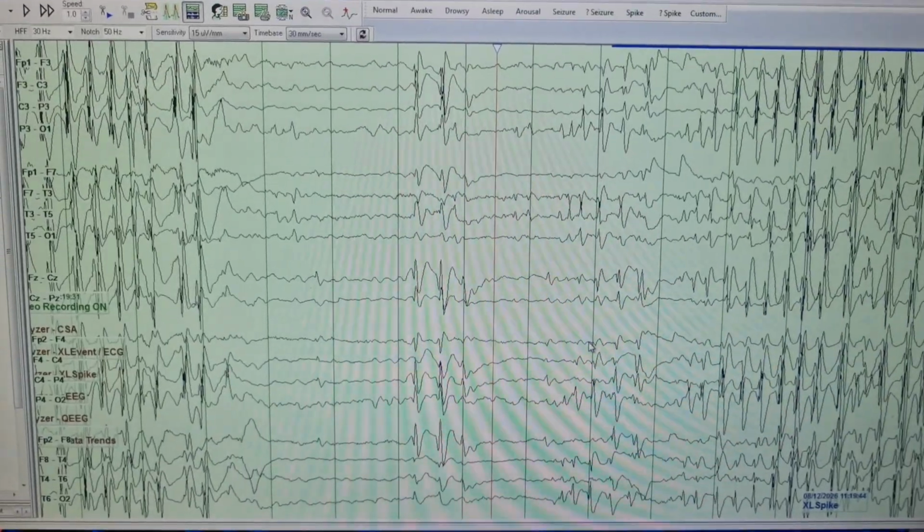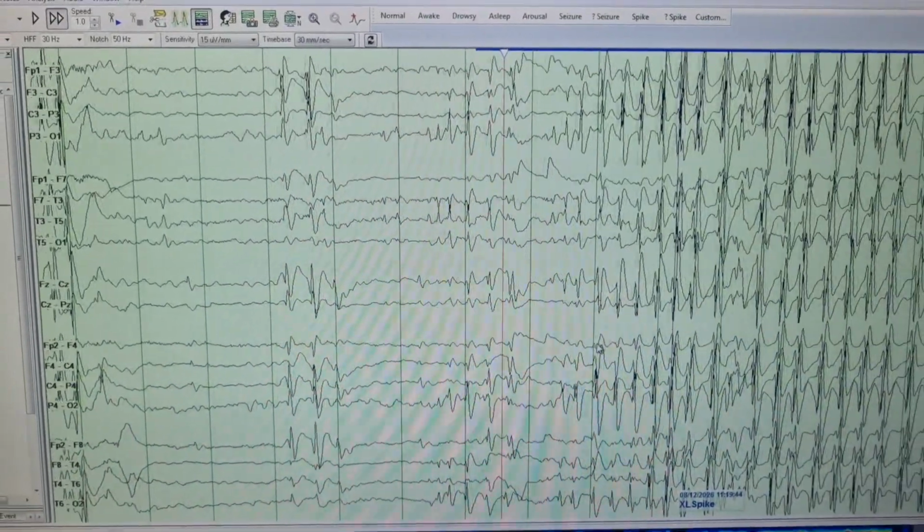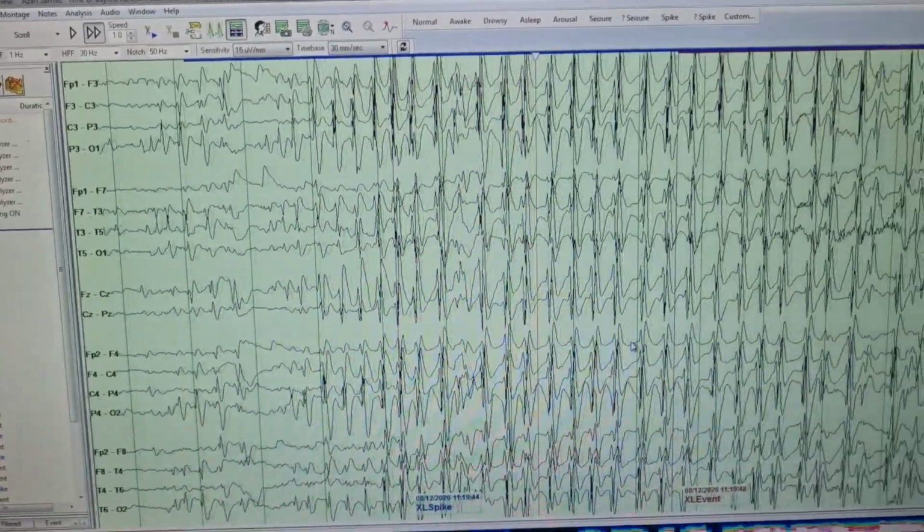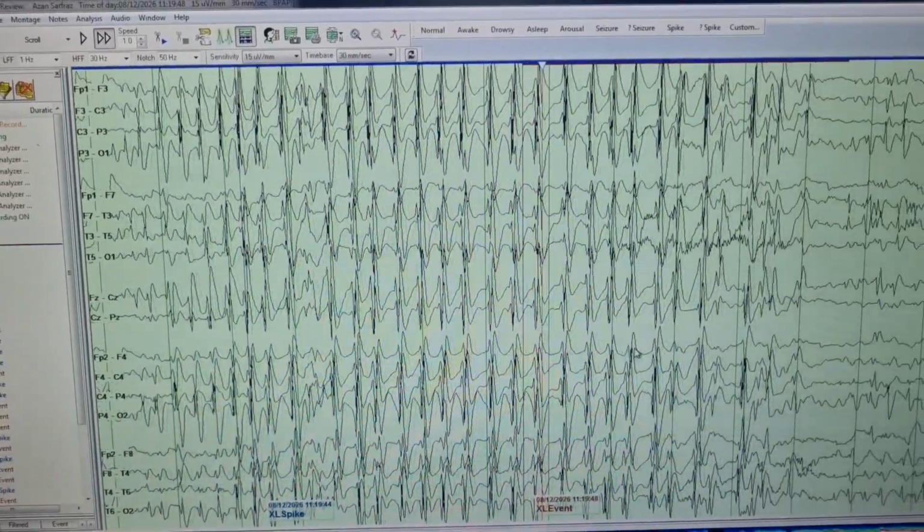This video will help you to understand very important concepts which we call electrographic seizure and non-convulsive status epilepticus. So while doing EEG, you can get two types of seizures.